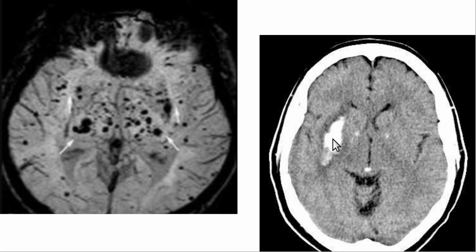Now here's a bigger bleed, this big white spot here. This is a CAT scan. In CAT scans, we talk about density because the radiation beam passes through the head. It's like a donut around the brain, and the beam comes out on one side and the detector's on the other side. These little tiny white spots, those are just incidental basal ganglia calcifications. This is just an incidental calcification in the pineal body.